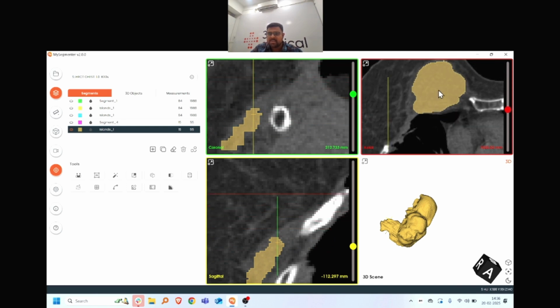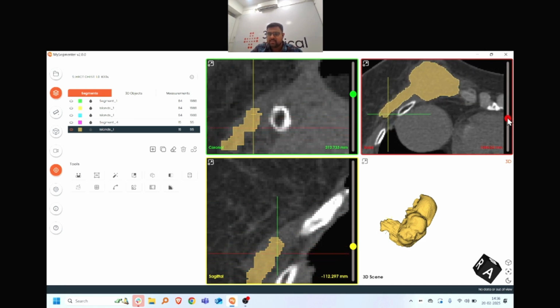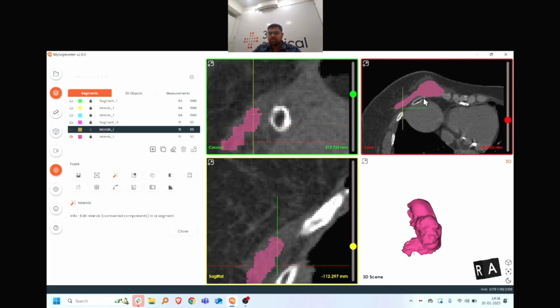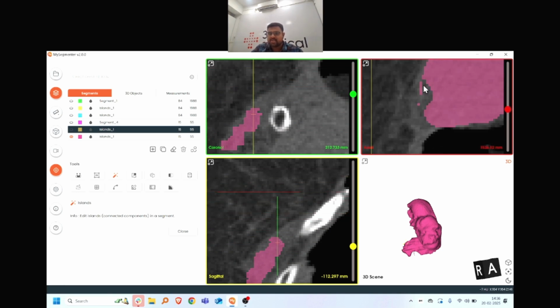And I'll check once if it is covering the bone information with it. And again, I'll use the island effect once more, so any unknown pixels that might be there and which are not in our concentration might get removed. So I see that now we do not need just a simple edit over here; I can use the contour editing option, and I can erase this portion like this.